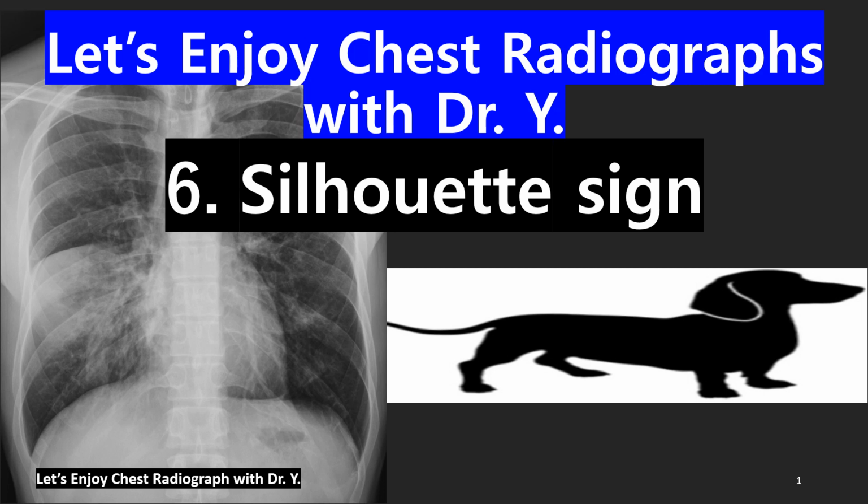Let's enjoy chest radiographs with Dr. Y. Session 6, Silhouette Sign in Chest Radiographs.